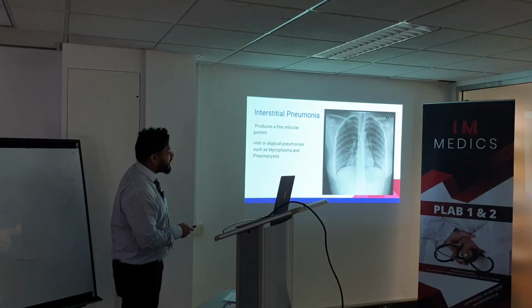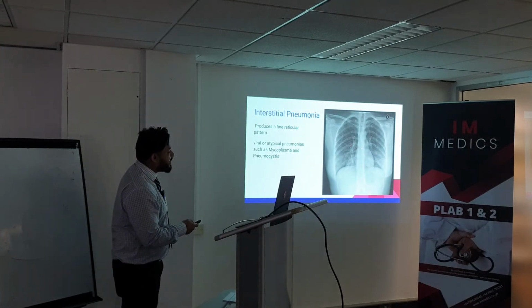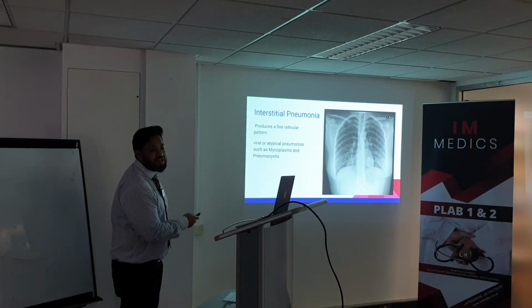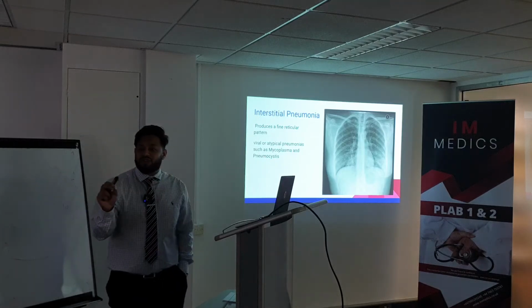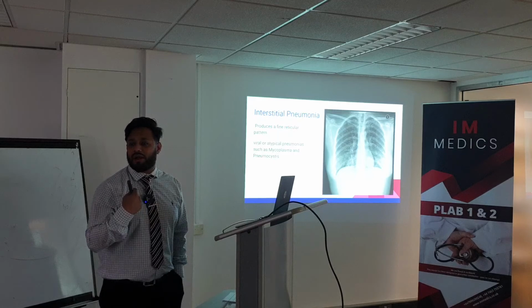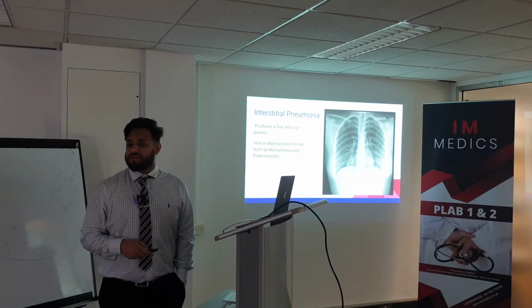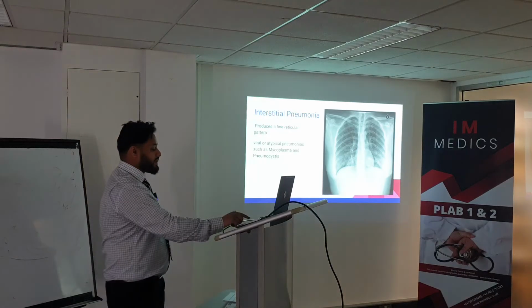So look at the angles, okay? Whether the angles are covered with liquid or not. Then the next part you look at is the hilar region, if it's there. The third thing is to look at that fluffiness, if it's everywhere. So when you listen to people's chest, you say, oh, I can hear crackles. Where are the crackles? Right upper. Then you do an x-ray, you see it right upper, then it matches with your clinical diagnosis. Does it make sense? That's how it works.